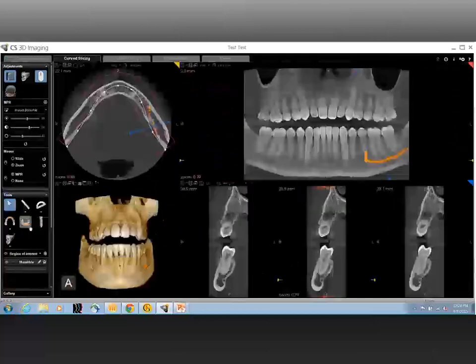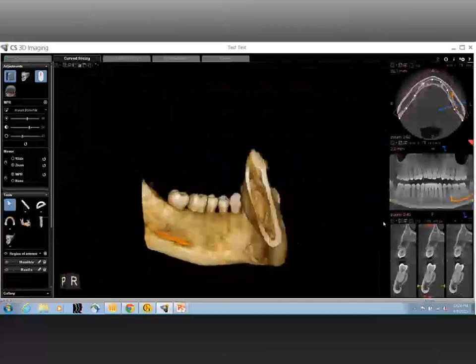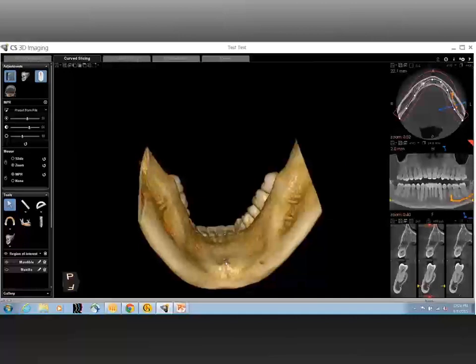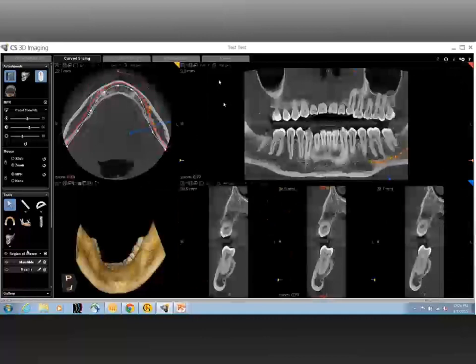Now, besides the mandibular foramen, we should also remember that we do have a lingual foramen that is ideally located around the genial tubercle, which is in the midline area between the two central incisors, as demonstrated. Right now, you can see it as a little hole. The lingual foramen opens into the sublingual space, so that is also a critical structure to be evaluated. So all in all, starting from cortical bone up to lingual foramen are all critical structures that definitely need to be, I would emphasize, visualized and interpreted.